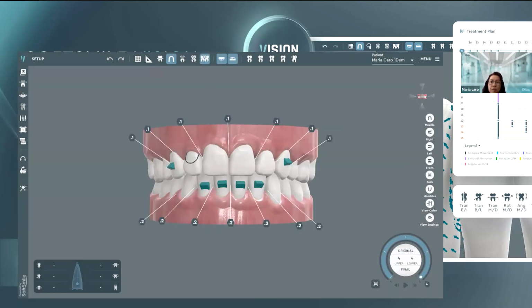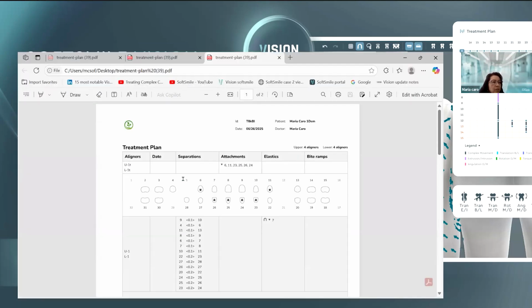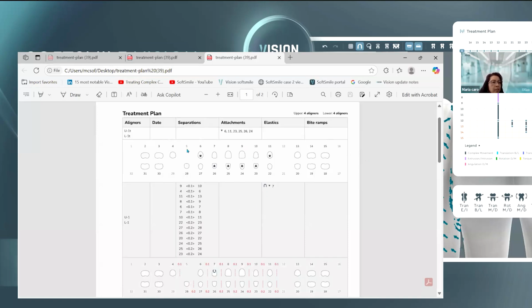What I'm going to show you now is what that looks like in the PDF report. As you can see here, we also revamped the visualization of the PDF report, and you can see the logo now at the top corner. We also have a new option, which you would reach out to us to let us know if it's something you want to activate, which is the option to hide client information. We can hide this cell from the visualization when you print it out, if it's something you would like to do.